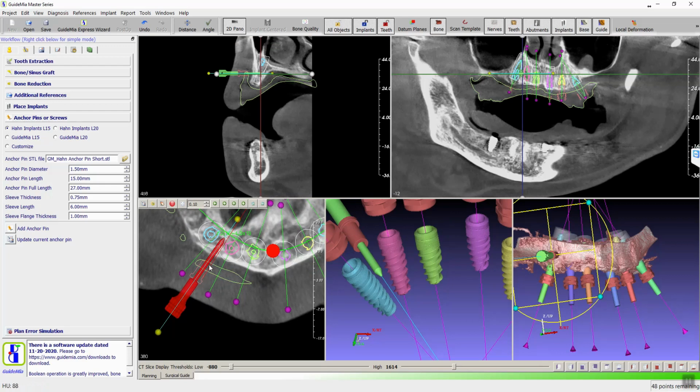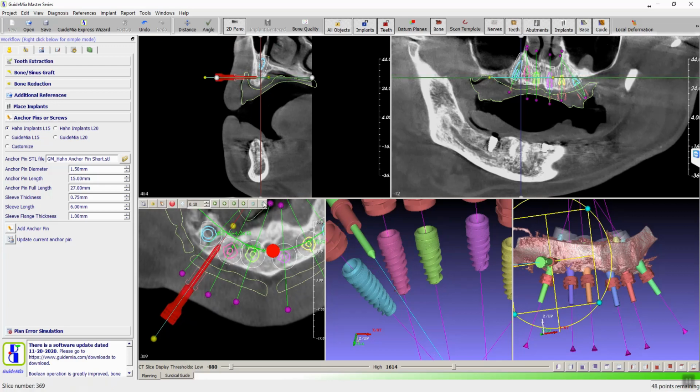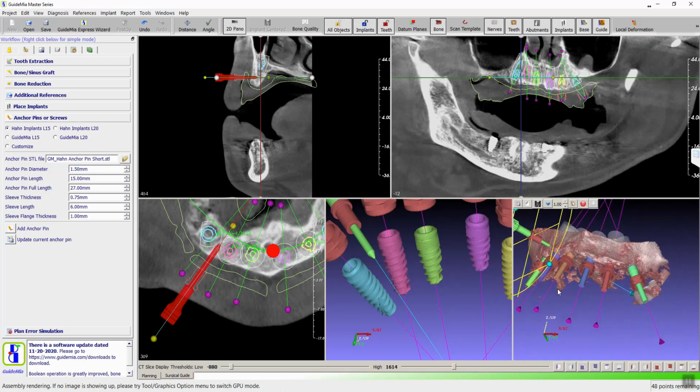We're doing the bone, so that should be fine. Oh, actually, we should go out a little bit if we want to do some tissue thing. Maybe higher. Yeah, we're still in the situation that we're gonna hit. That's okay. That's not important right now, because we can adjust the anchor pins and plans. I think we're more interested in how we get from this into our stacked surgical guides. Place it here, right? I would say let's just place 2 pins for the moment.